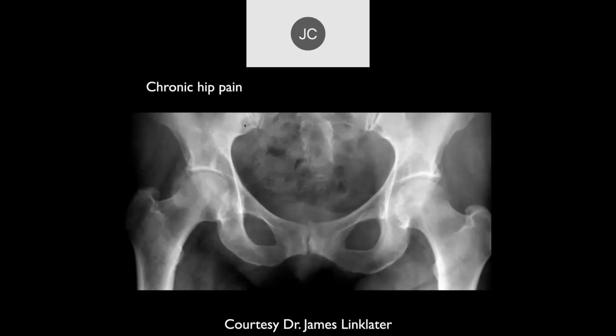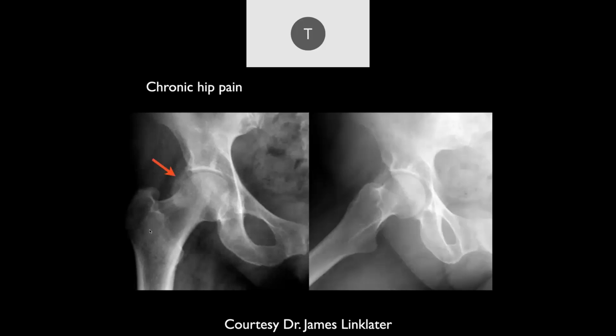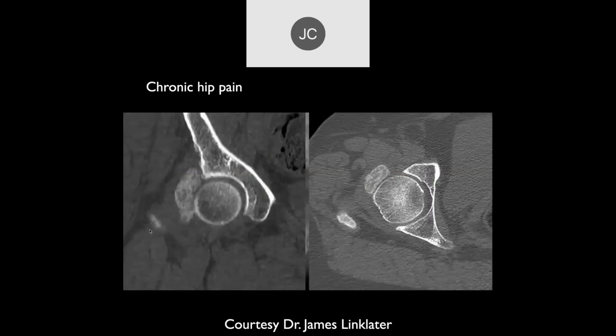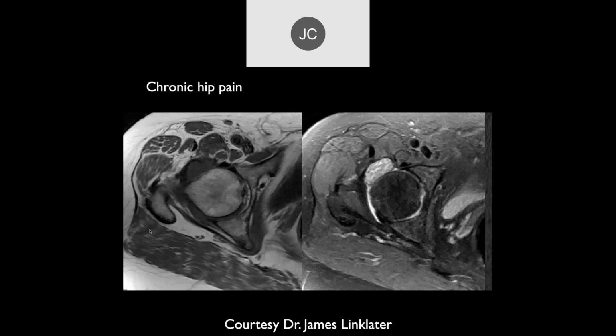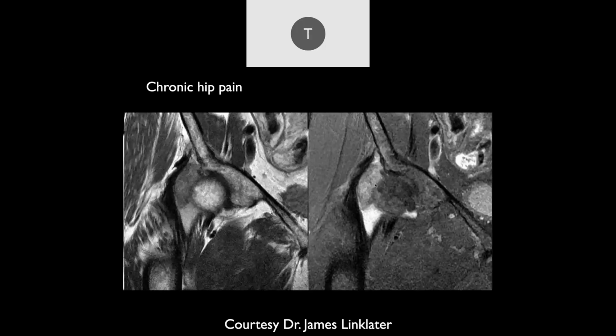Okay, here we go. All right, so there's some mineral density in that right acetabular region. Right through there. Here, the frog leg view. So you want a CT scan? Sure. There's a CT scan. Some lobular calcific density in the joint space. And then here's the MR. It looks kind of heterogeneous, like some sort of inflammatory mass. I kind of think, could it be some sort of synovial mass? Whatever. But this turned out to be CPPD disease.